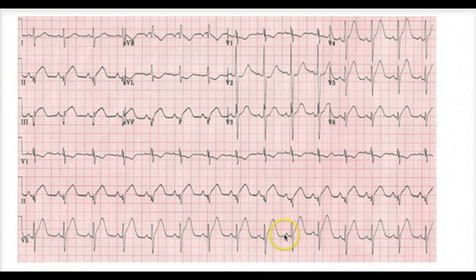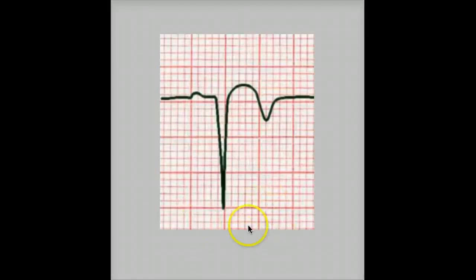Now we're not considering these because we can see PQRS normally. So these ones don't qualify. We only look at the ones where we have a Q wave followed by an ST segment elevation. So in this EKG, this is again a huge picture of a Q wave and an ST segment elevation. There is no substitute for examples, right? So we could never get sick of it.